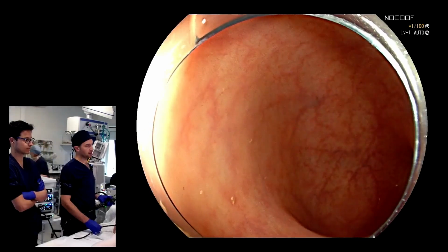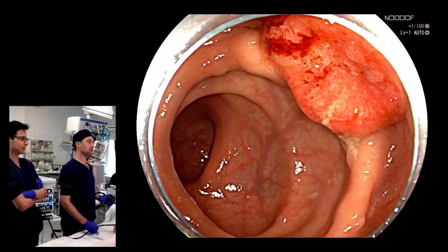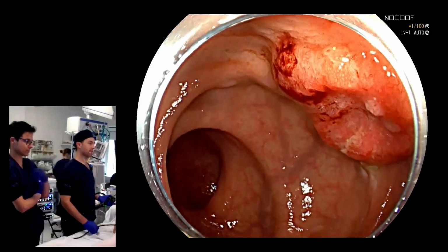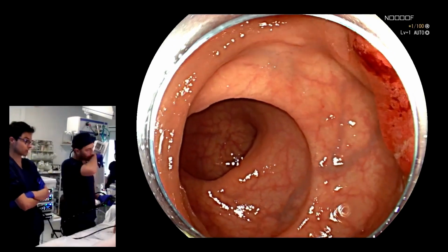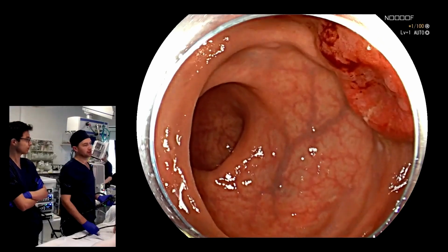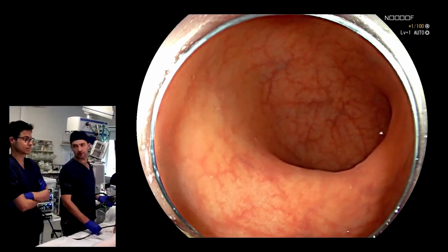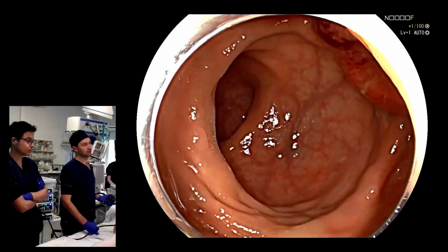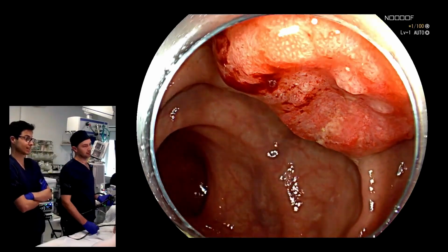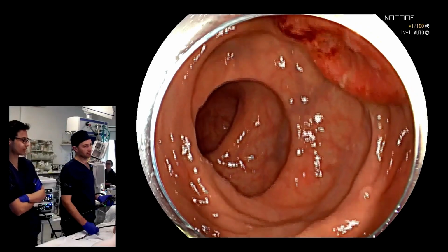So the patient is on the left lateral, there's fluid over here, and it's opposite the lesion. So what does that tell us about the position of this, or does that help us? This is important. I think we can say the lesion is located on the right wall, also a little bit on the posterior. The reason you're saying it's on the right is because the patient's on their left and the fluid's on the left. Yes, it's on the contralateral wall compared to the fluid, and in this case the fluid is on the left. So we can infer this is on the right. And actually, we felt it also to confirm it before with our finger, and this is true.